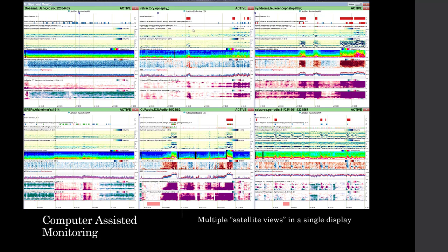And so without digging too far into what each trend will do, we're going to do that in a moment. At this top middle one, I can see these red marks for seizure detections. Not hard to pick that out. We can also see this change in the rhythmicity spectrogram. This curved pattern indicates something that's rhythmic and evolving, which is one of those hallmarks of a seizure. We see changes in the other trends as well.